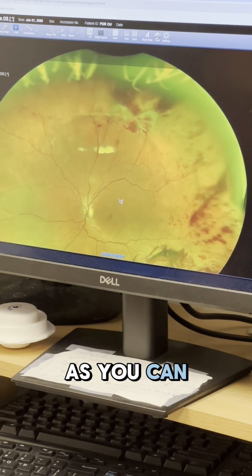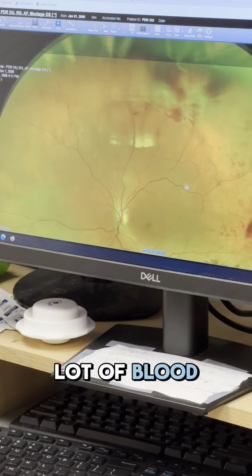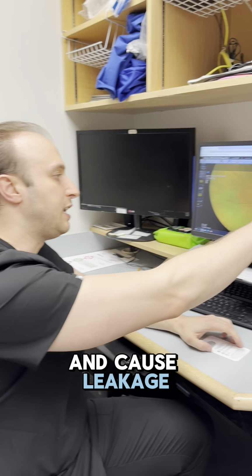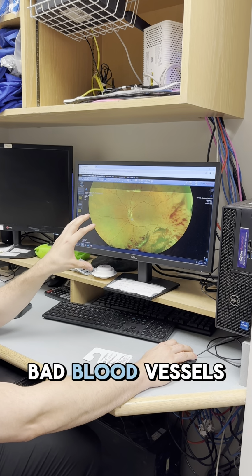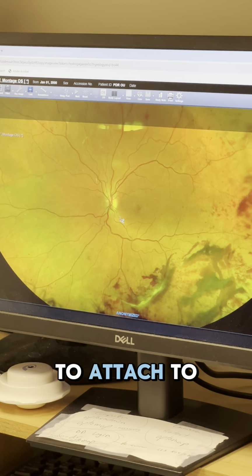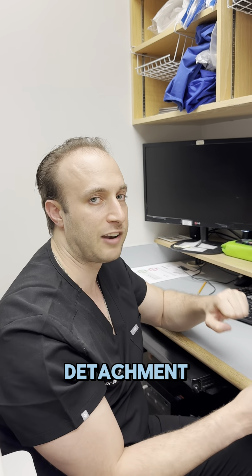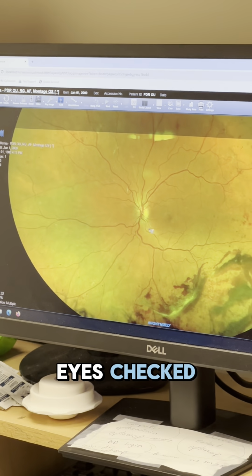earlier, as you can see, there's a lot of dark red here, which is a lot of blood. And this is basically when one of those bad, weak blood vessels burst and cause leakage of blood in there. And the problem with having these bad blood vessels in our eye is it can start to attach to the vitreous, which is the jelly part in our eye, and cause pulling of the retina and cause a detachment. So that's why it's very important to get your eyes checked if you're a diabetic.